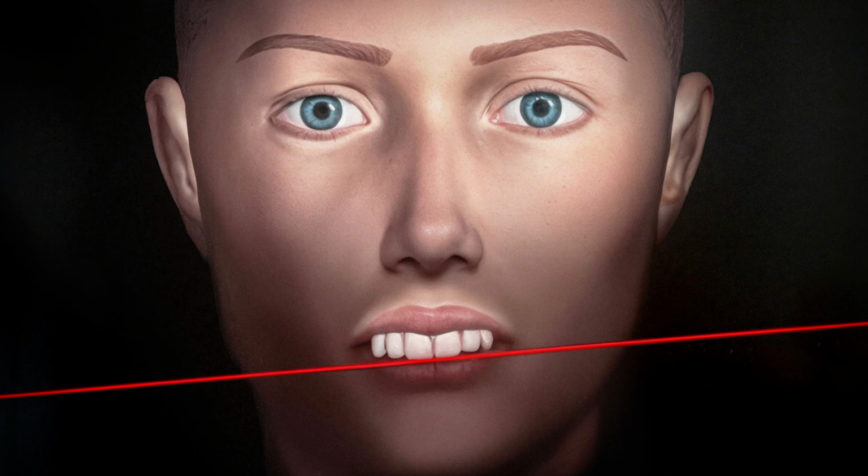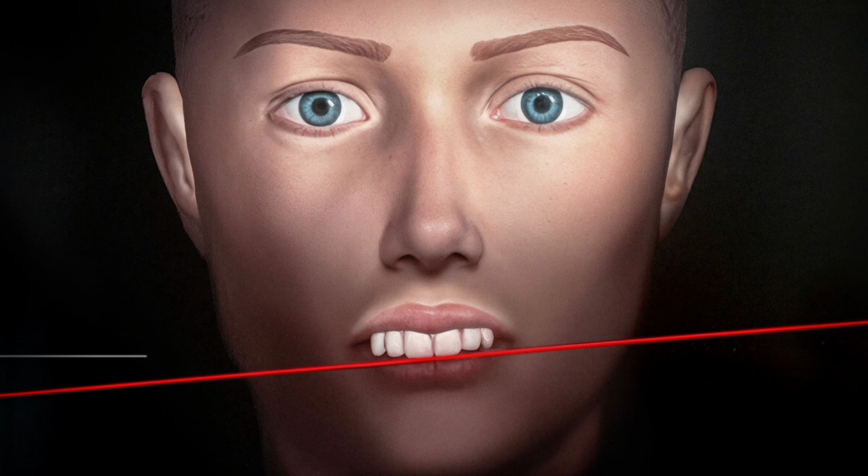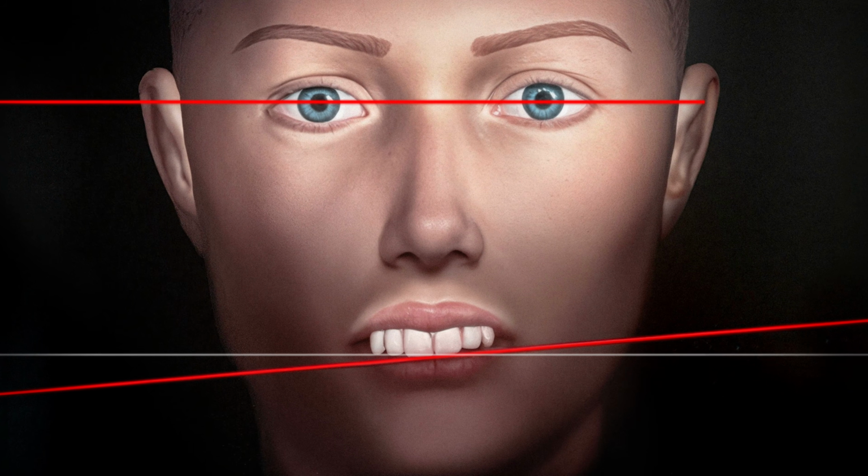Let me give you an example. I had a patient requiring new crowns in the upper jaw due to caries disease. So as always, I prepped the teeth, took an impression and a face bow record and sent everything to the lab. A week later, the ceramic crowns came back for try-in and there was a big surprise. The crowns fit on the teeth, but they didn't align with the patient's occlusal plane and pupillary line. The crowns looked awful and it was impossible to chew on them properly. I couldn't adjust those inaccuracies and therefore the technician and I had to redo the whole work. That was an absolute bummer.